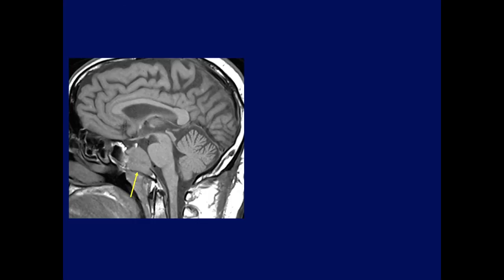What is this lesion? Somebody mentioned intraosseous meningioma, but this was not the case.